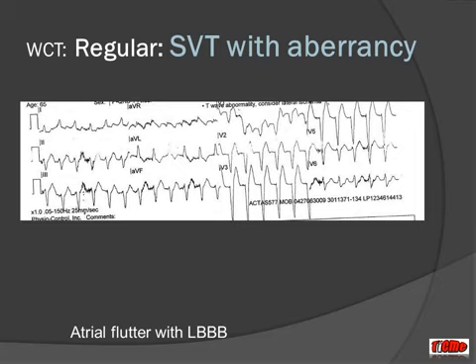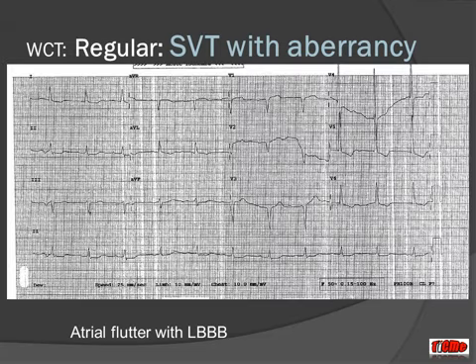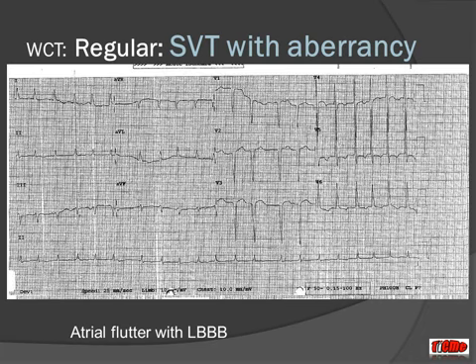So luckily we got one, and you can see that the sinus rhythm ECG again shows a left bundle branch block. How do I know that this patient was predisposed towards flutter or fib? Well, again, bit lucky, a year before they had come in with atrial fibrillation, an irregular wide complex tachycardia here, but again showing typical left bundle branch block. So fairly comfortable now to diagnose that first ECG as atrial flutter with 2-to-1 block and a left bundle branch block.